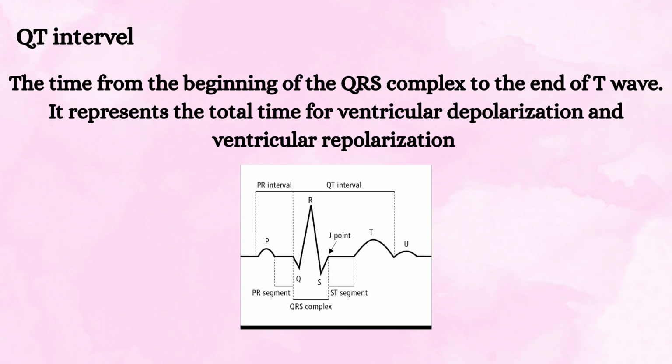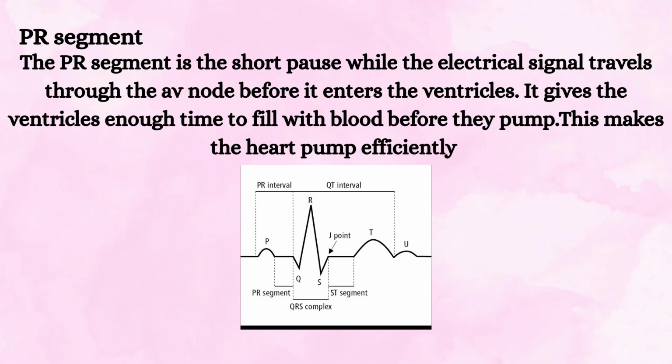QT interval, the time from the beginning of the QRS complex to the end of the T wave. It represents the total time of ventricular depolarization and ventricular repolarization.